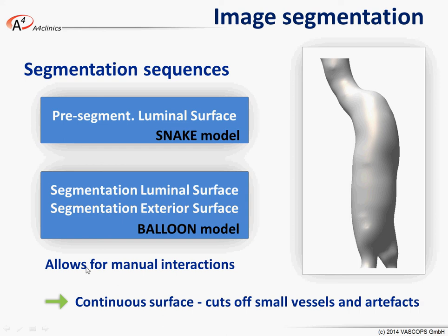At the moment, it's just important that this technique also allows for manual interactions, simply because medical images are always full of artifacts, and it's very unlikely that a fully automatic algorithm will provide a highly accurate image segmentation.